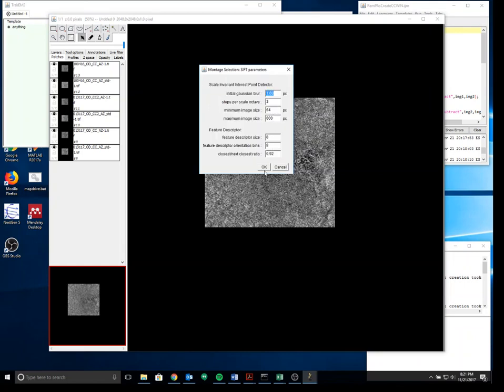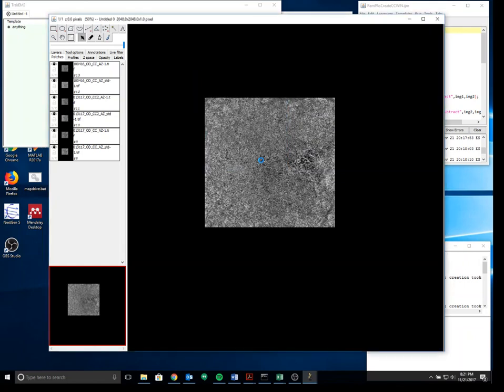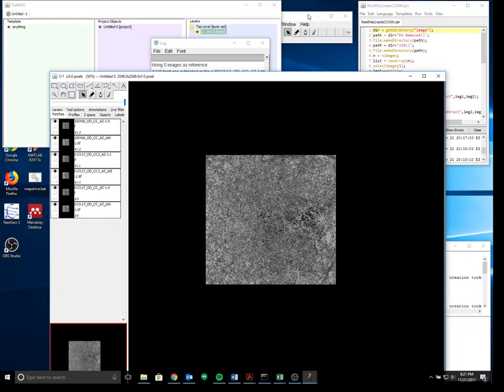And at this point we just hit OK, OK, OK all the way through, and it will just think, and you can usually get a little status bar that'll show up soon up here. So it's going. Usually the more images you're trying to align, the longer this will take. This should take under a minute, but if you have about 20 images, it can take about 5 minutes to really align, at least in my experience.